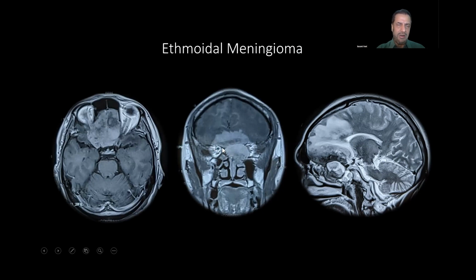So there's a lot of feeding coming from the skull base. So you need to detach everything before you remove these tumors. So the attachment is big, there's edema, and both sides of the brain are involved. These are difficult cases again.